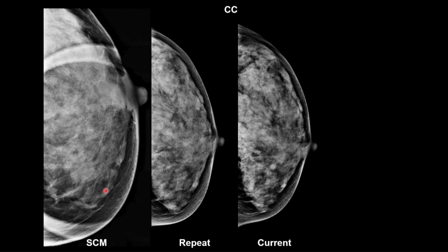You can do TOMO. If we had done screening TOMO back at the screening exam, we might not have had to even think about recalling her. If we hadn't done TOMO, now is a good time to do one instead of this. Or if you're not sure, in addition to this. And then that will also help you decide whether it's real or superimposition, because the superimposition on TOMO is apt to spread out as you go through that part of the image. If, on the other hand, with any of these approaches you still see the finding, then the workup continues.